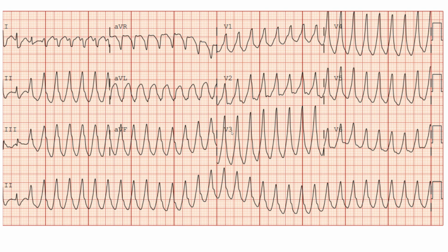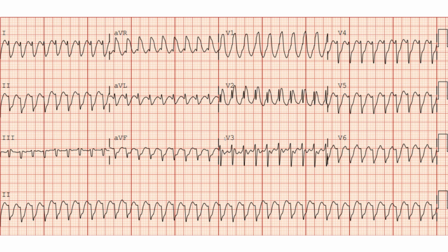So most of this does not look like ventricular tachycardia, but guess what? It was VTAC, okay? The gentleman we saw first, he went to the electrophysiology lab and it wasn't inducible VTAC. They found an ectopic foci in his atrium. Okay, so this wasn't an atrial arrhythmia. But they did the same thing.